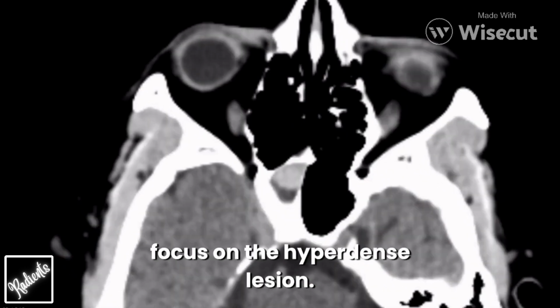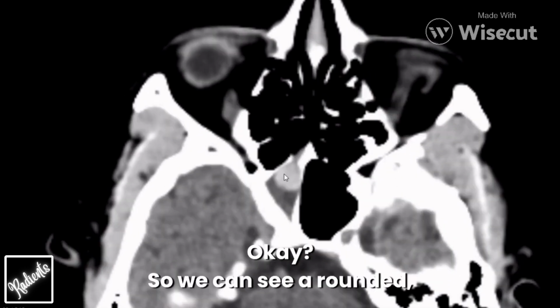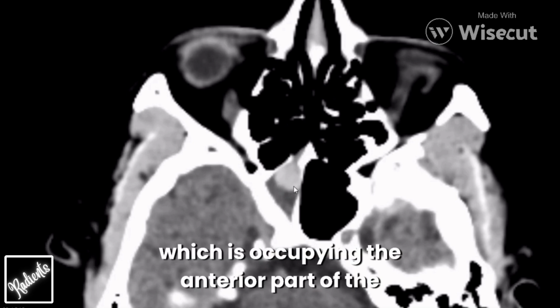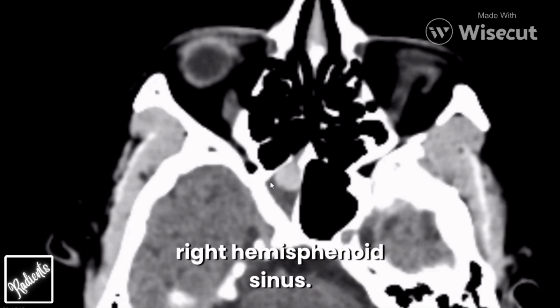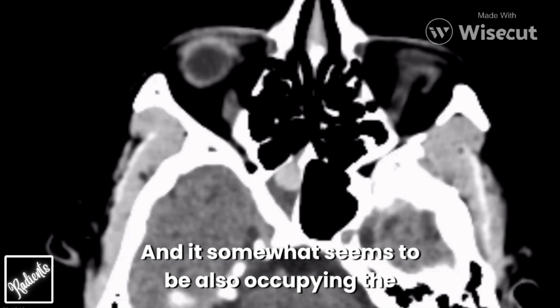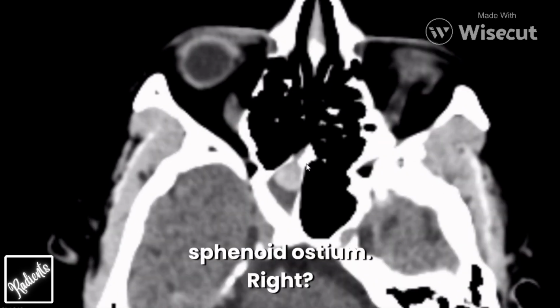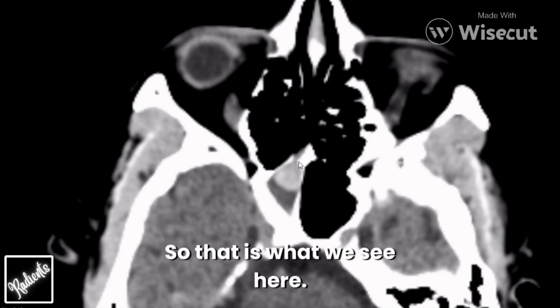So first of all, let's focus on the hyperdense lesion. Okay, so we can see a rounded homogeneously hyperdense lesion which is occupying the anterior part of the right hemisphenoid sinus, and it somewhat seems to be also occupying the sphenoid ostium, right? So that is what we see here.